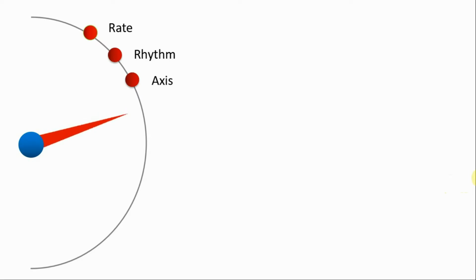Look at lead 1 and look at AVF. That will give you some idea. Is it normal axis? Is it left axis deviation? Is it right axis deviation? Is it extreme axis deviation?